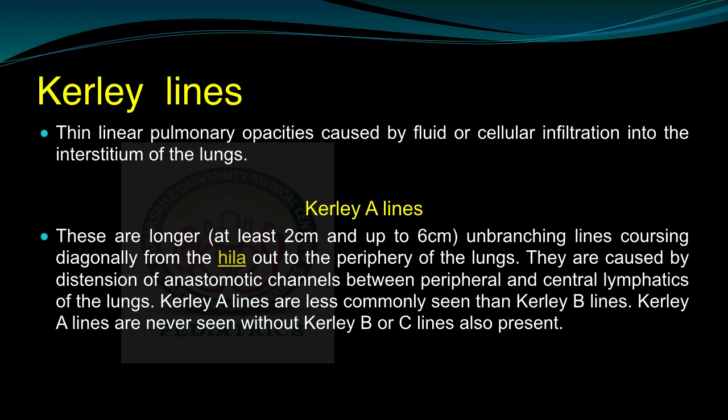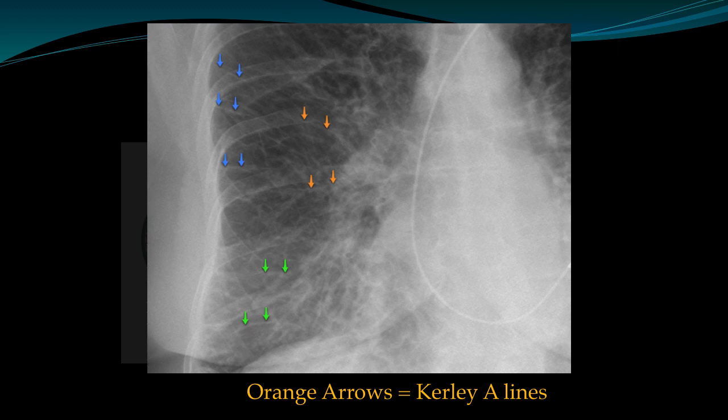Kerley A lines are less commonly seen than Kerley B lines. Kerley A lines are never seen without Kerley B or C lines also present. Now take note that the Kerley A lines are represented by the orange arrows.